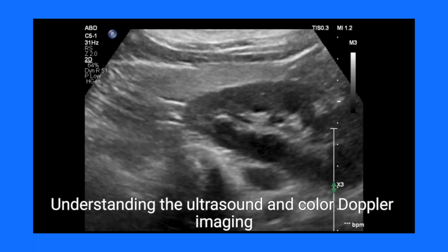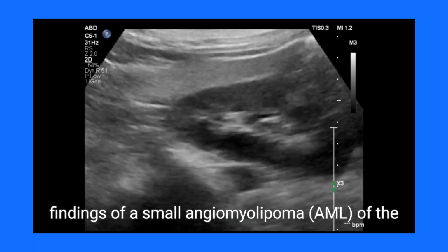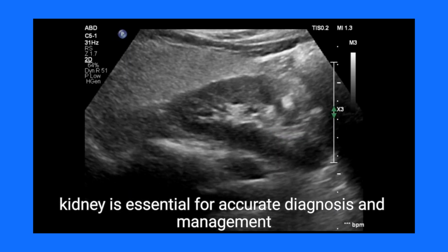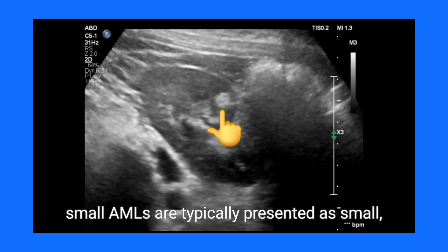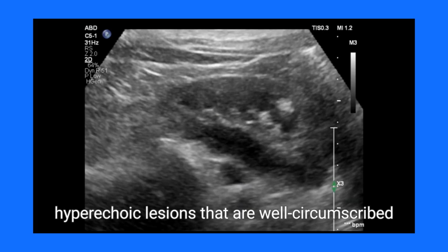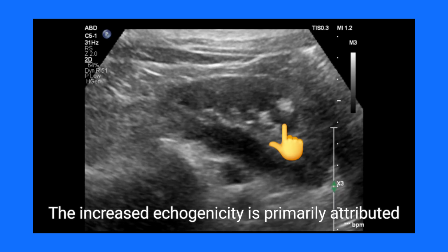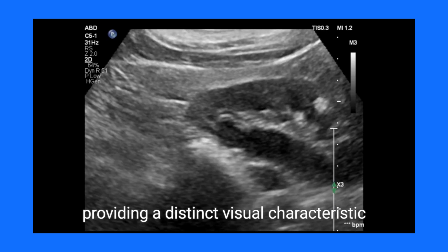Understanding the ultrasound and color Doppler imaging findings of a small angiomyolipoma, AML, of the kidney is essential for accurate diagnosis and management. On grayscale ultrasound, small AMLs are typically presented as small hyperechoic lesions that are well circumscribed within the renal cortex. The increased echogenicity is primarily attributed to fat content within the tumor, providing a distinct visual characteristic.